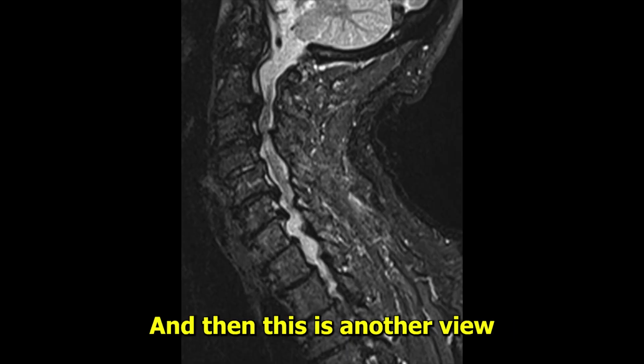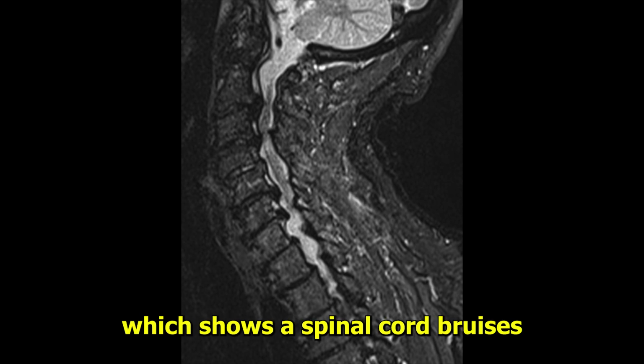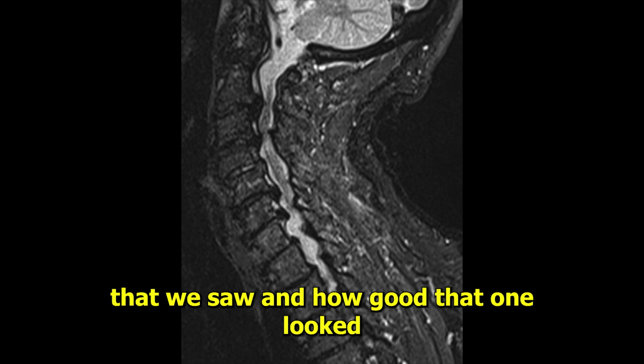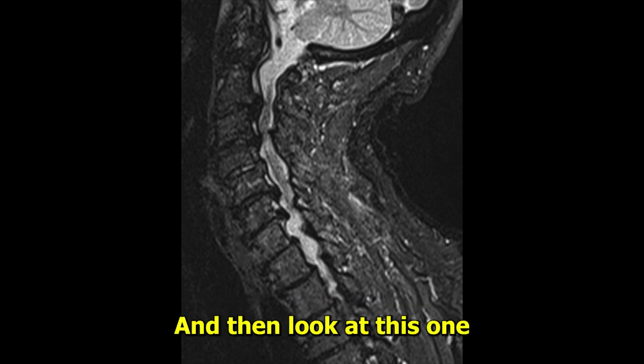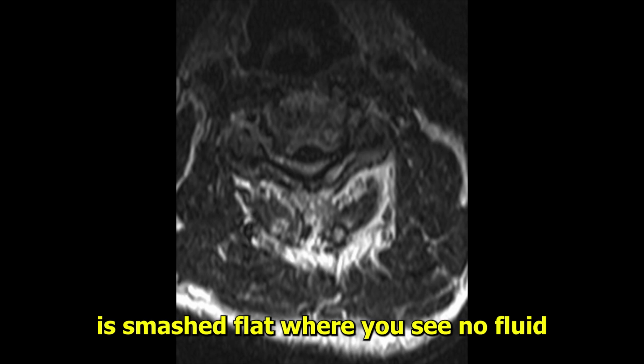And then this is another view which shows the STIR sequences, which shows the spinal cord bruises. Compare that to the first film that we saw and how good that one looked. And then look at this one. The spinal stenosis is just extreme. The spinal cord is smashed flat where you see no fluid around it.